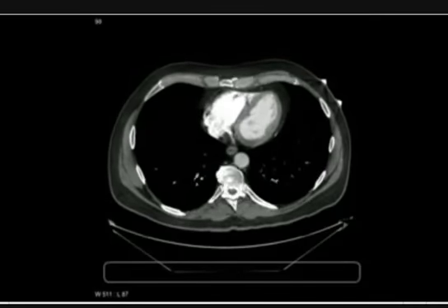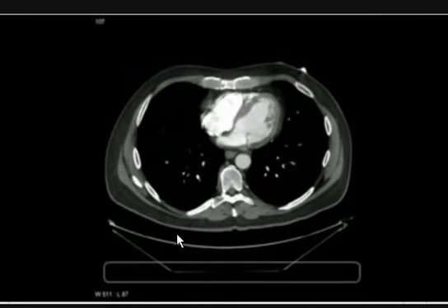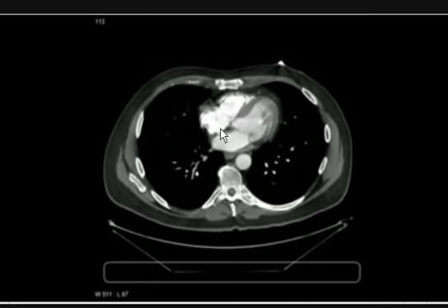Okay, so going up. Now this is left atrium. You can see valve here. The contrast in left ventricle is diluted as compared to the right ventricle here. Okay, so this is right atrium somewhere here. The left ventricle will eventually give rise to aorta somewhere here. This is left atrium again. These lines and these dots are pulmonary vessels. Either they're branches of pulmonary artery or pulmonary veins.